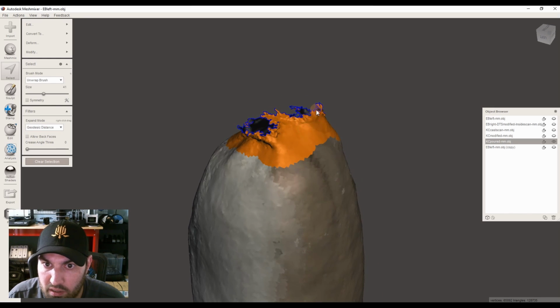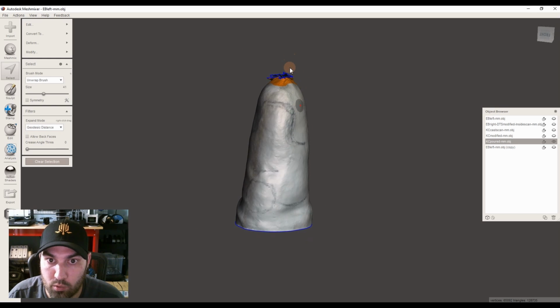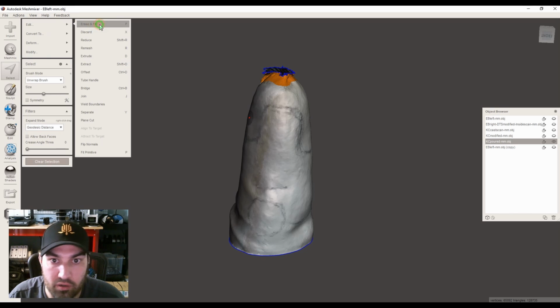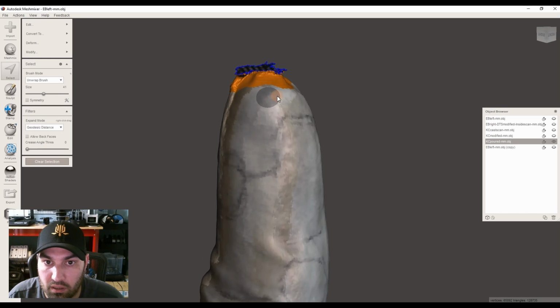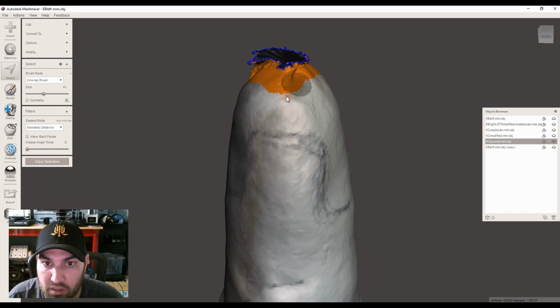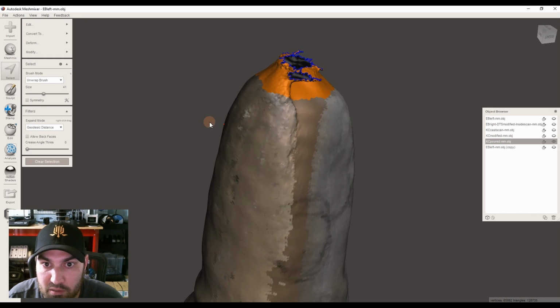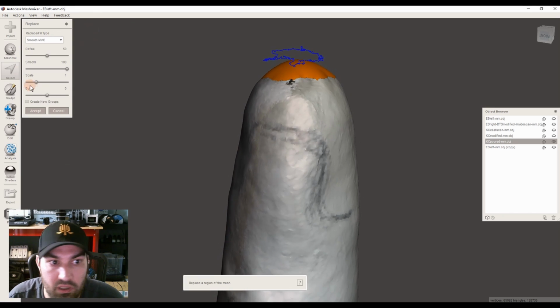So the scanner is kind of the same thing. When this is inverted on a table, capturing the distal end nicely is kind of always one of the hardest parts. So in this case, it's a locking limb or a locking suspension. So the distal end of the limb is going to get set by the shape of the lock anyways. So losing that is not a huge deal.